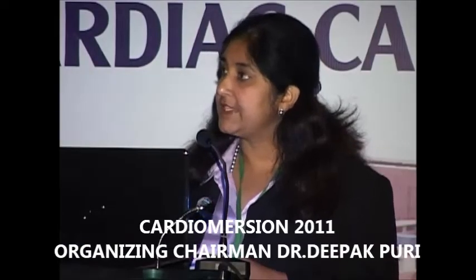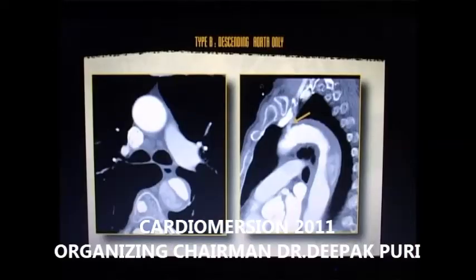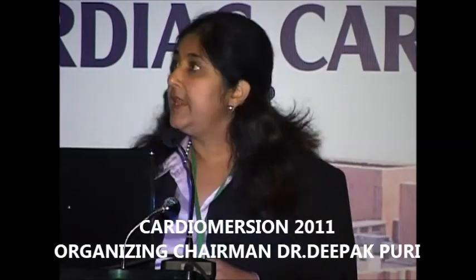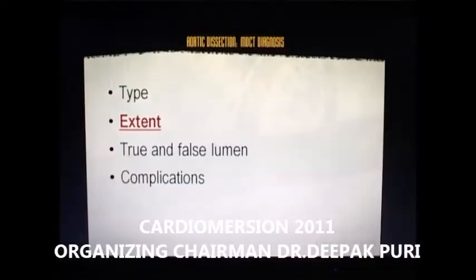The type B dissection, this is an example. So this is the ascending aorta, and this is the descending thoracic aorta, which is slightly dilated. And it is demonstrating that this is the true lumen and this is the false lumen. And as you can see on the reconstruction, this is the left subclavian artery taking off and the dissection starting right after that.